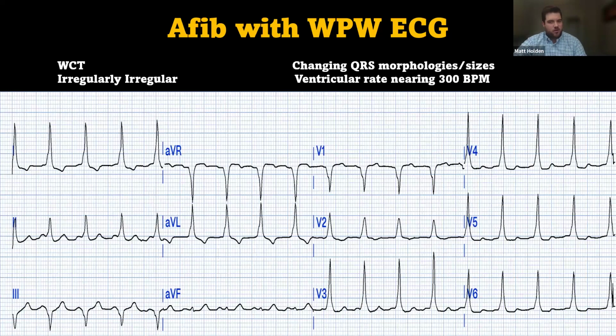And this is the post-conversion 12 lead. Now, I do have a quick question. Does anyone know what medications you should not give in AFib with Wolff-Parkinson-White?